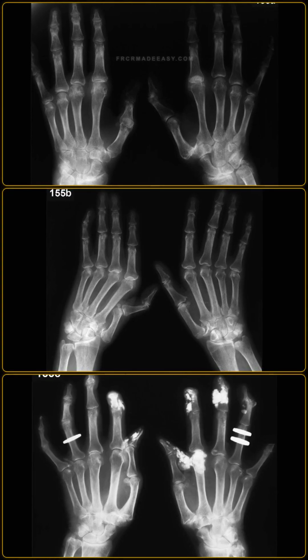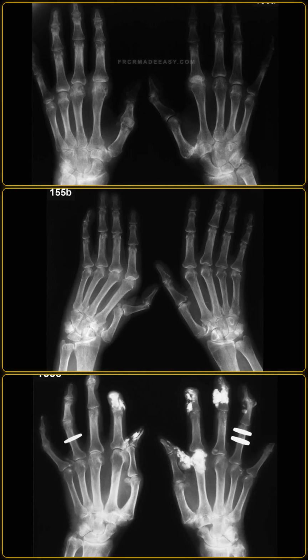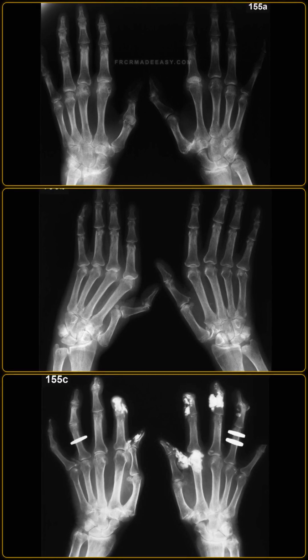As a radiologist, I would recommend comparing these hand radiographs with prior exams to assess the stability and progression of the joint subluxations. I would recommend obtaining a baseline renal ultrasound to screen for medical renal disease or scarring, as lupus nephritis is a major cause of morbidity.